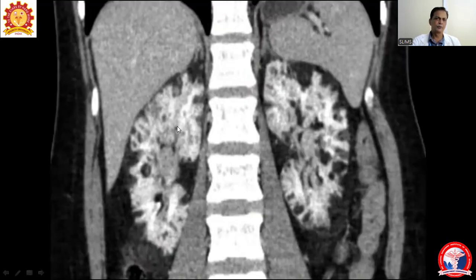We're talking about angiomyolipoma. Most of them are single. Now here there are multiple areas. This is again a CT scan image, a coronal cut. Post contrast thin coronal cut it is. What we are getting to see is multiple, almost innumerable, well defined, close to fat intensity lesions. So these are multiple angiomyolipomas. There are certain syndromes associated, we'll discuss further. One image is there.